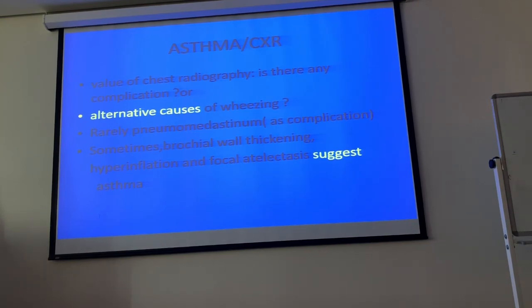What about emphysema? Can you diagnose it just from X-ray? Yes, you can. All this what we saw was emphysema on the chest X-ray. Rarely pneumomediastinum as a complication can be seen, and I will show you one case.